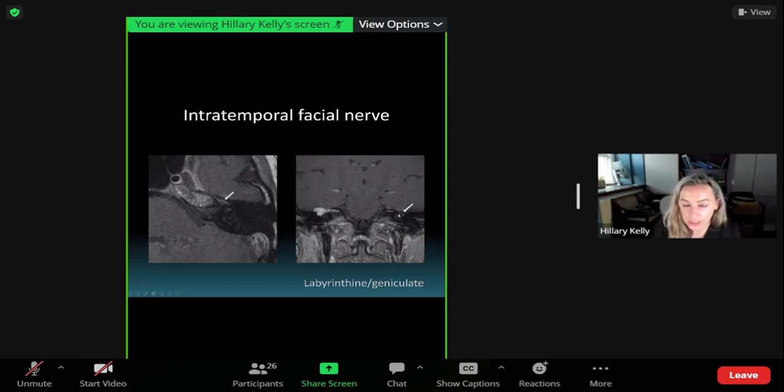The vestibule is the most central structure of the bony labyrinth. When you're looking at it on MRI, it's going to be T2 hyperintense. Again, you're not really going to be able to resolve that utricle and saccule. And it's very close to the fundus or apex of the IAC.